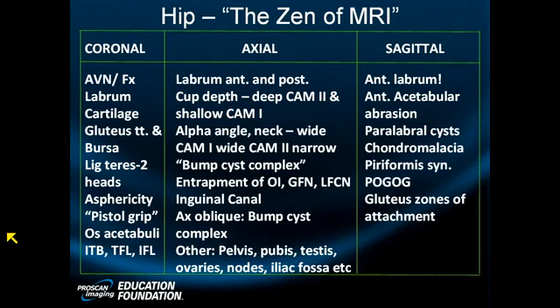So elevated alpha angle. Does that mean he's got cam impingement? No, it doesn't. It means he's got a morphology that predisposes him to it. One of your colleagues sent me a beautiful article of orthopedic surgeons and imagers that got together en masse. It's called the Warwick Agreement for femoroacetabular impingement.